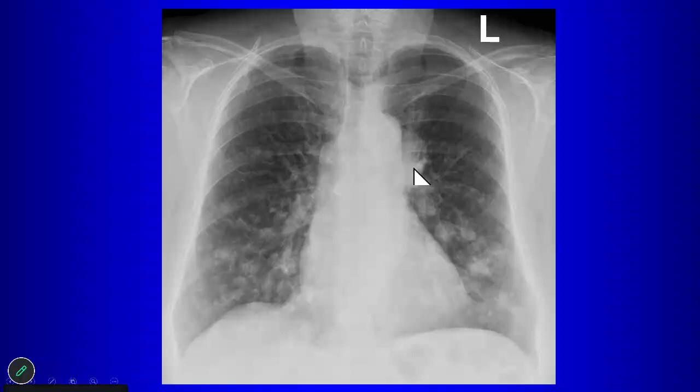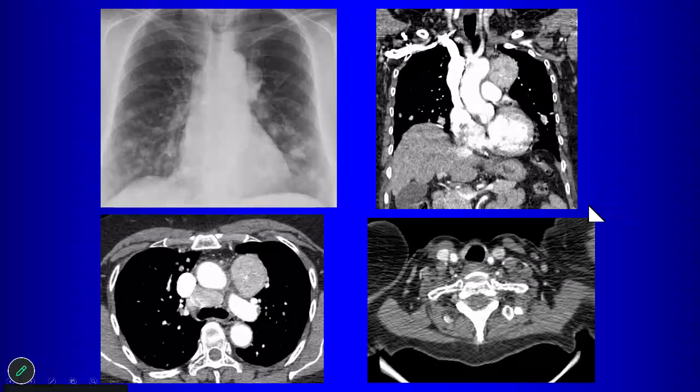Well, what else do we see on the chest radiograph? Could be metastasis. Well, what else is abnormal on the chest radiograph? Multiple metastasis. Well, what are you going to call these opacities? What do we call round opacities in the lung? Nodules, yeah. So we have bilateral lung nodules with this mass here in the aortopulmonary window, right? So the mass in the AP window we suspect might represent lymphadenopathy with bilateral lung nodules, so we're concerned about malignancy here, okay?